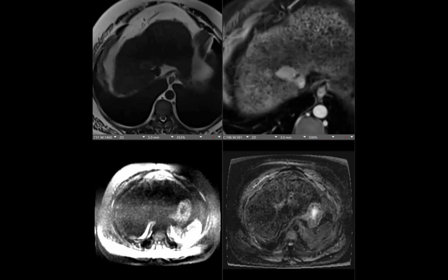In this case, we already have some of the staging because of the lymph node we saw. And I think they must have diagnosed it even on cystourethroscopy and on the CT. But for any kind of staging of the urethra, like seeing invasion of adjacent organs, lymph nodes, etc., MR is much better. But yeah, this was just a rare case for me because we don't see urethral cancers that much, and then also the post-op.